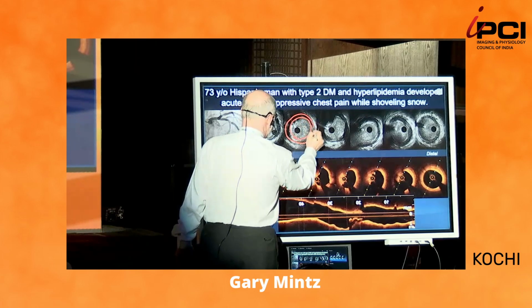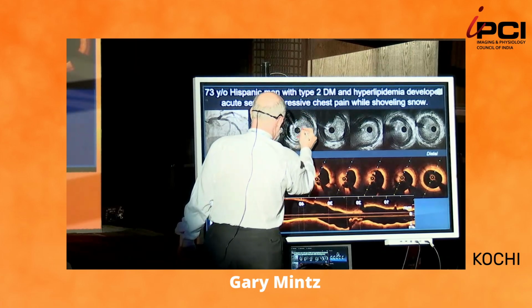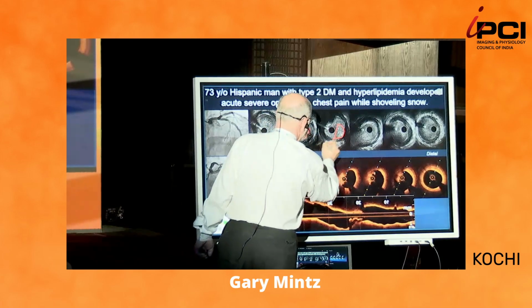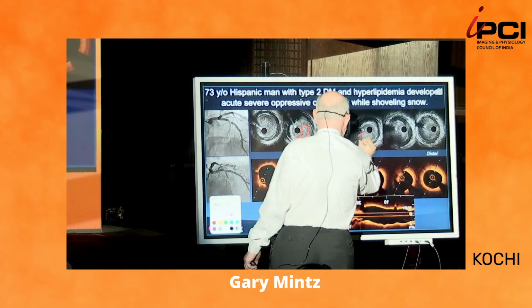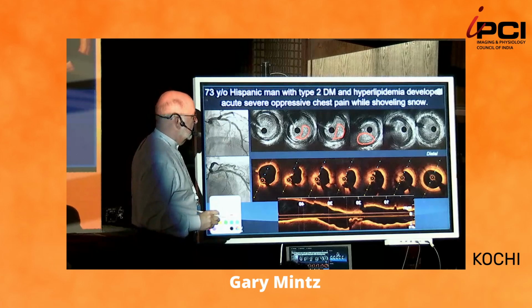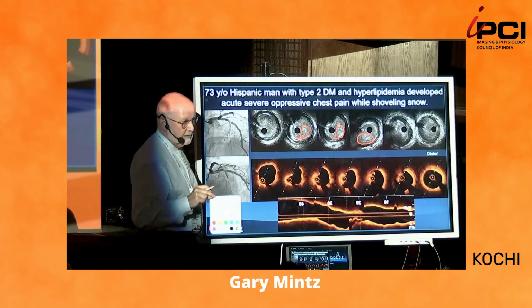Maybe 40 to 50% at most. And then, what's this? And what is this? I can't see better on an actual screen than this. So thrombi are not easily diagnosed by grayscale IVUS. It's better with HD IVUS than with regular IVUS, okay?